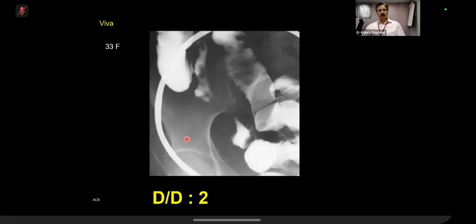There is further stricturing which I could see in the part of the large bowel that is seen. Could be the transverse colon. No, this is just above another loop of small bowel. Okay, all right. So if that is a loop of small bowel, still I can see some narrowing and stricturing in that part as well. So if that's a stricture as well, that would represent a skip lesion.